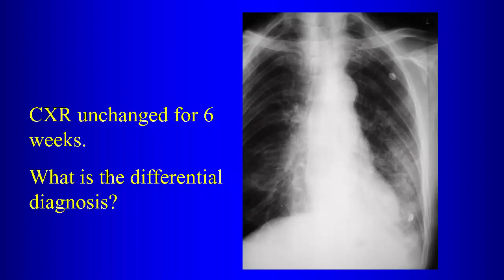Well, I wouldn't call that reticular opacities. What would you call it? I mean, reticular opacities are kind of linear. I would call both reticular and airspace. Yeah, so there's definitely some airspace disease here.